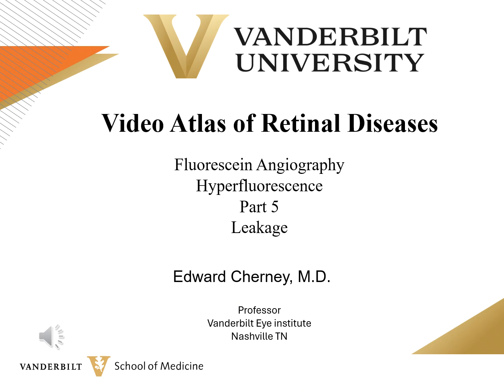In the first section on hyperfluorescence, we spoke about transmission defects. This is hyperfluorescence caused by an absence of pigment, generally in the pigment epithelium, whereby you see the normal choroidal fluorescence. In this section, we will start with hyperfluorescence because there is too much fluorescein where there should not be any, and in this section, we'll be talking about leakage from different tissues.